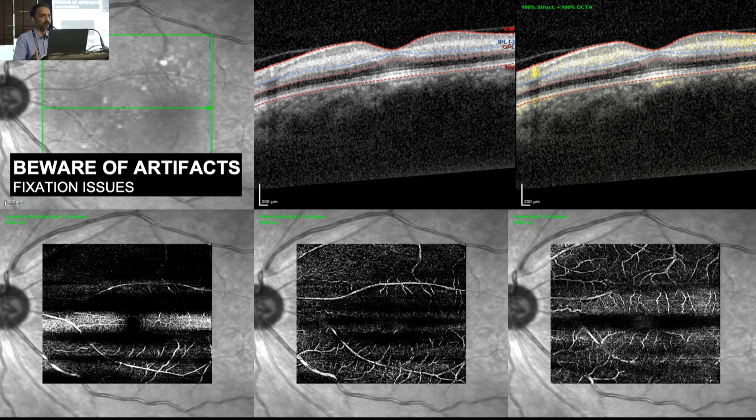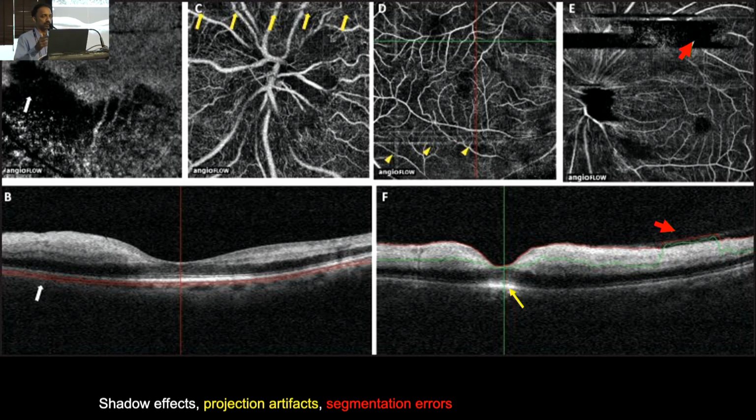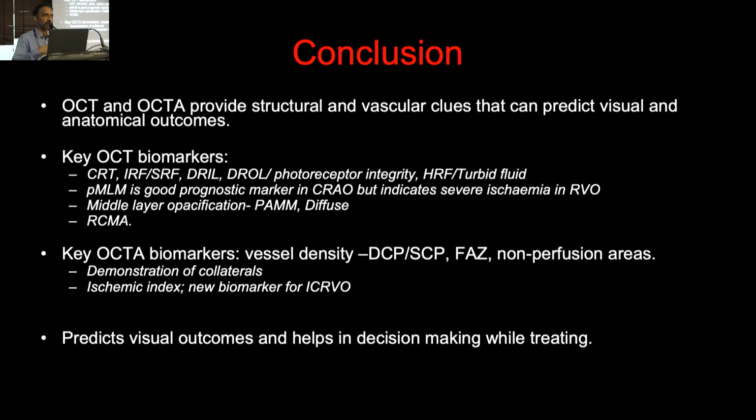This is how you get the images. So you have to be aware of these artifacts. There could be shadow effects, projection artifacts, segmentation errors. So you have to interpret all these findings, putting your clinical skills also into practice.